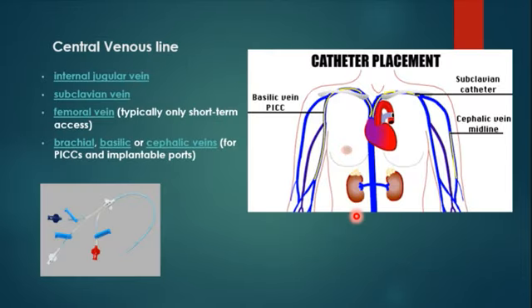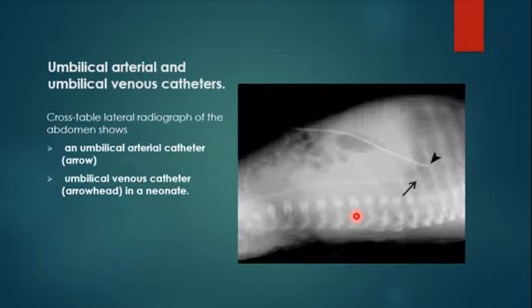Now shifting to another important point. Does the umbilical artery line need to be above the diaphragm, or where is it? No, as I mentioned, it will be either in a higher position, reaching up to T6 to T9. The important thing is to stay above this to avoid vascular complications.